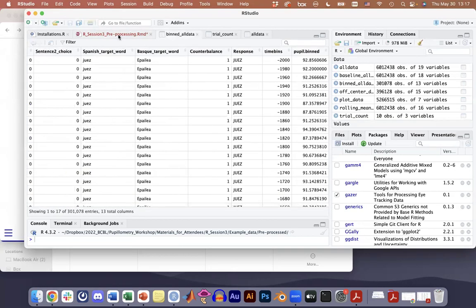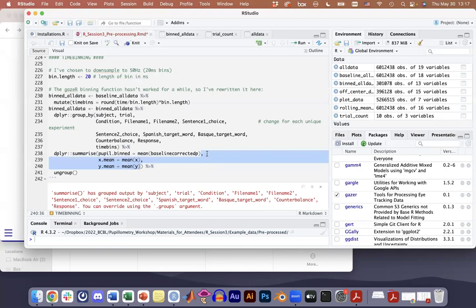Yeah, okay. So if you get rid of the X and Y means, I added this days before the workshop and I probably didn't double check that I did it correctly. Delete this and run it again and it should be better this time. I don't know why. Maybe Daphne and I will look at it later and think about why. I probably just made some wrong assumption about how to write the pipe. Yeah, now it's right. Yep, okay.